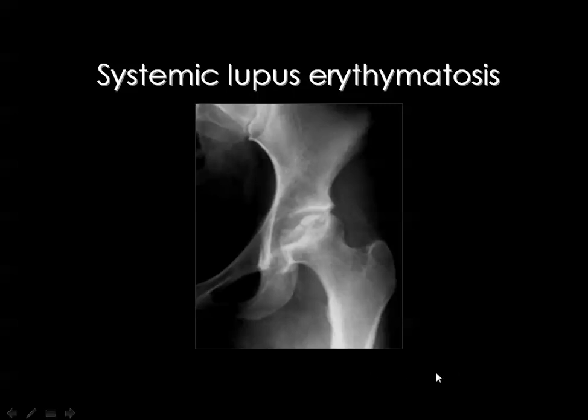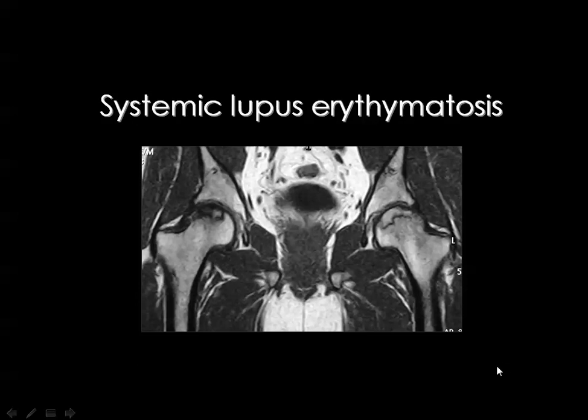This is an X-ray of the left hip showing the typical appearance of avascular necrosis of the femoral head with collapse, flattening, sclerosis, and fissures, all the manifestations of avascular necrosis. You remember in the lecture on the hip joints, I mentioned that the pathognomonic sign of avascular necrosis in the femoral head is the presence of this black line separating the dead bone from the normal bone.